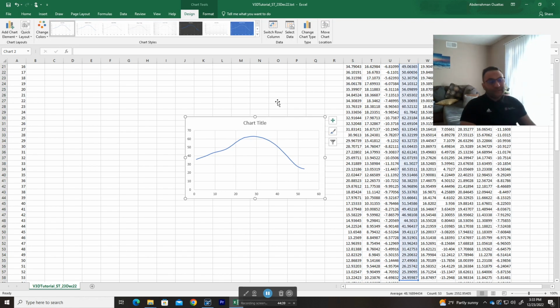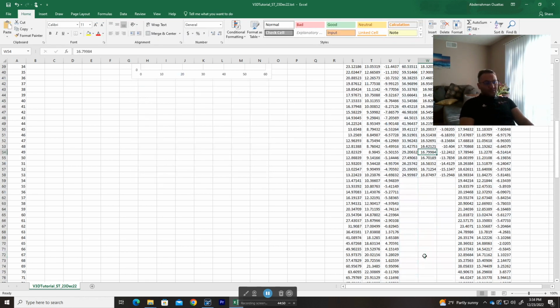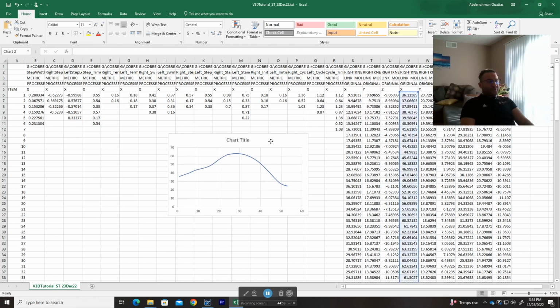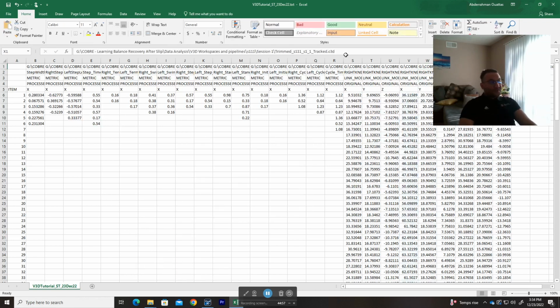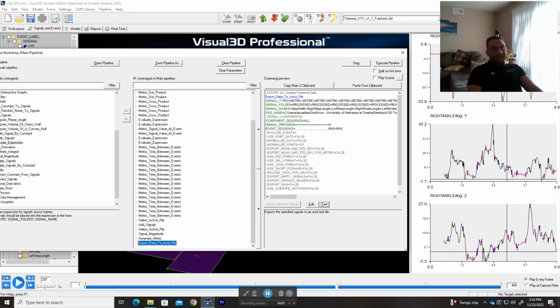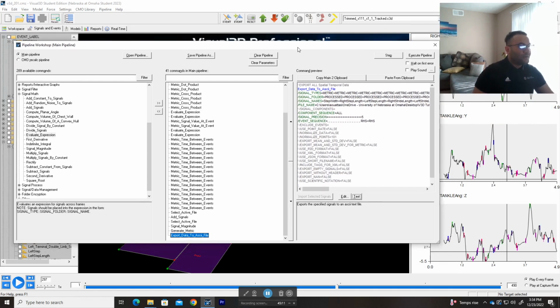What they did here is export the right knee angles from right heel strike to right heel strike, but in different columns. You're probably wondering why it is like this. That's because it's not gait, it's a slip trial. That's why the right heel strike is not perfect. But if you have normal gait, like walking on a treadmill or walking on the ground, it should be fine.